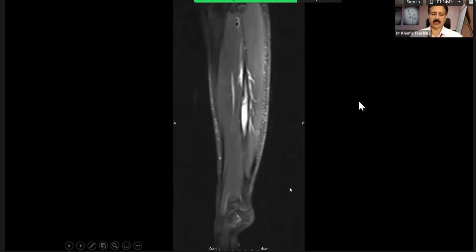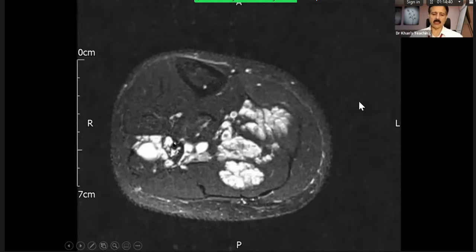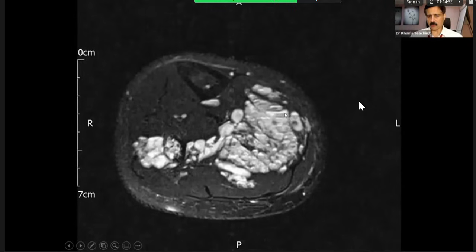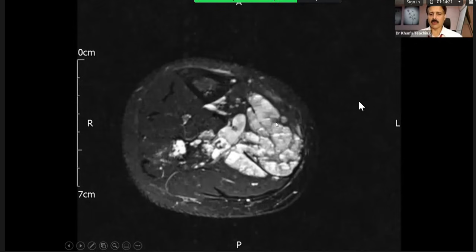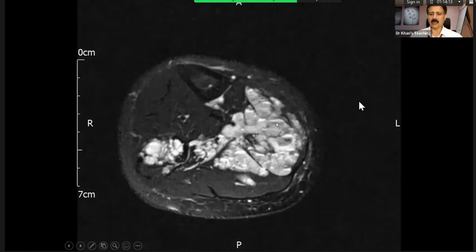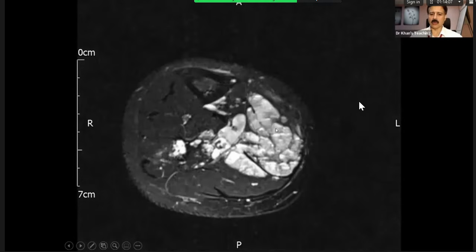So what is happening is that this lesion, as we saw, is invading the bone, it is transspatial, it is intramuscular. And here, if you look carefully, there are fluid levels. And this is that phlebolith, this is that phlebolith. And key viva point is how will you confirm it? Interestingly, you will confirm it with a Doppler. So what we do is just a compressive study with Doppler, and it will just compress. Compressibility is what you are looking for.